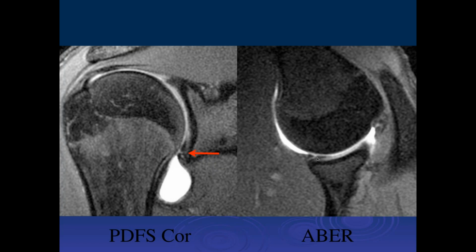But one thing I want to remind you is that there can be confusion, and I don't think I talked about it enough in our initial lecture on the shoulder: the glenoid is typically rotated in the sagittal plane, or the oblique sagittal plane. What's straight inferior on a typical MR image is actually more anterior and inferior on the actual anatomy of the glenoid itself. So if you're in the anterior aspect inferiorly down here, this is more of an anterior-inferior tear because of the rotation of the glenoid in that sagittal plane.